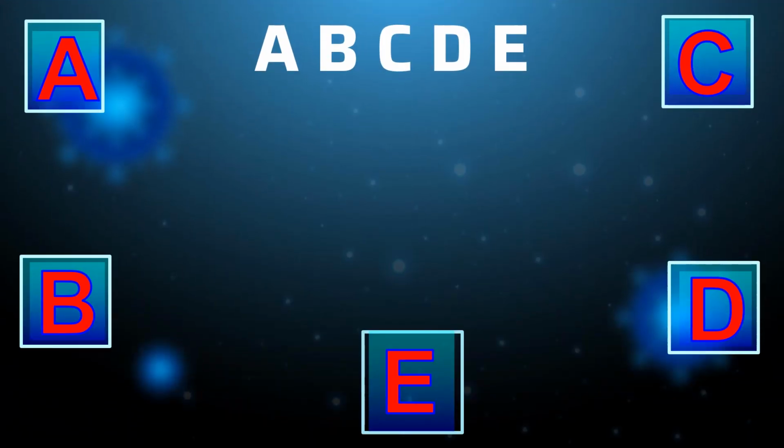The A, B, C, D, E method of chest X-ray analysis will be presented to ensure a consistent, systemic analysis of all components. A stands for airway and will address the appearance and location of the trachea, carina, and major bronchi.